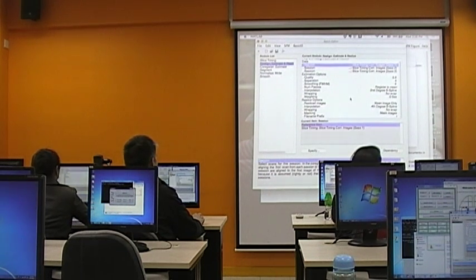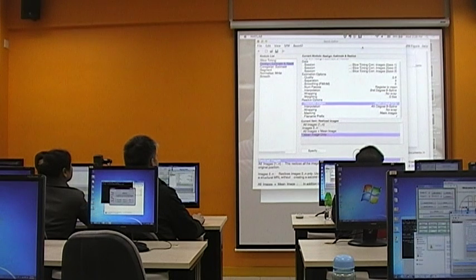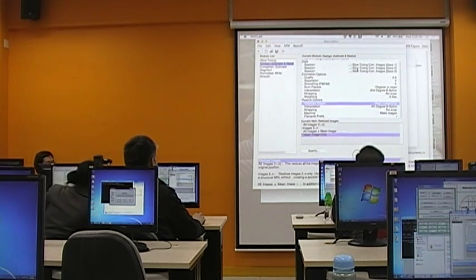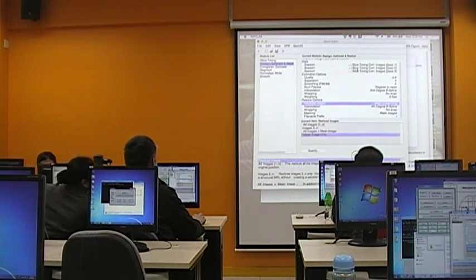The other option you need to change is the reslice options. As I said, we want to avoid interpolation as many times as possible. So here we are not really writing out a new set of images, but we are only creating what we call the mean image, to represent the average anatomical details with the modality of EPI.